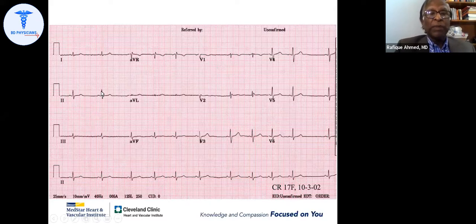There is a P wave upright in lead 1, 2, a little bit flat in 3, which can happen, then upright in lead AVF. There's sinus rhythm, normal PR interval, normal QRS duration, and QT interval. But there is an irregularity in here. If we look at the irregularity, you can see that it is slow and becomes fast, then slow and fast. It has happened twice in 10 seconds, and in 1 minute, it is 12.